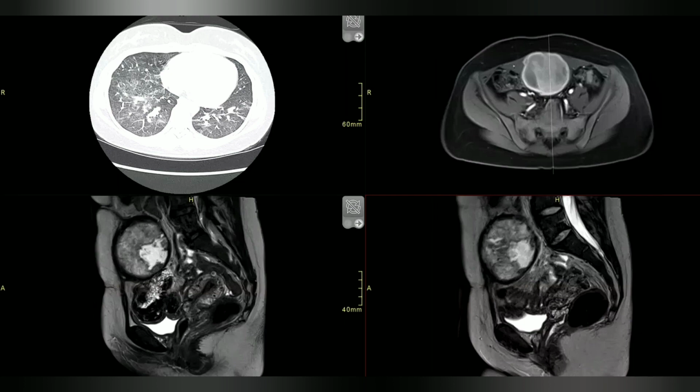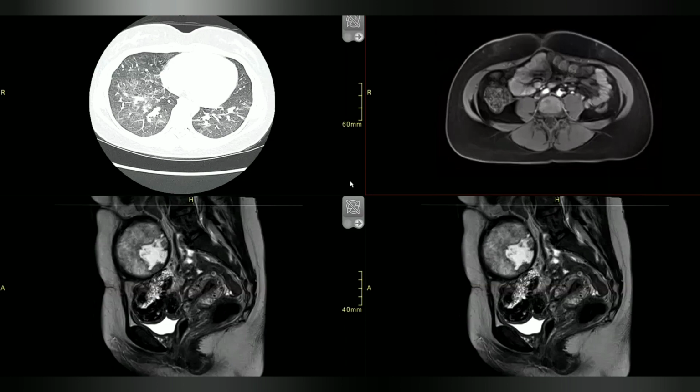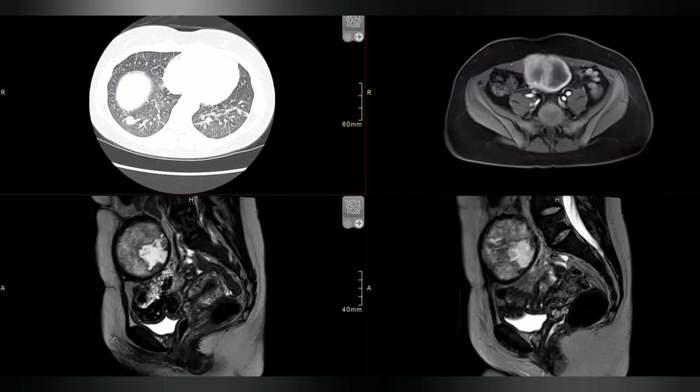And then what other possibilities are there? There are very few. She didn't have anything before pregnancy, so then you have to think about these gestational trophoblastic diseases. This is choriocarcinoma, metastatic. You can see the lung mets, and there's an incidental finding in the lungs. Do you see all that ground glass, all that airspace disease? So this was chemotherapy-induced pneumonitis due to cyclophosphamide and methotrexate.